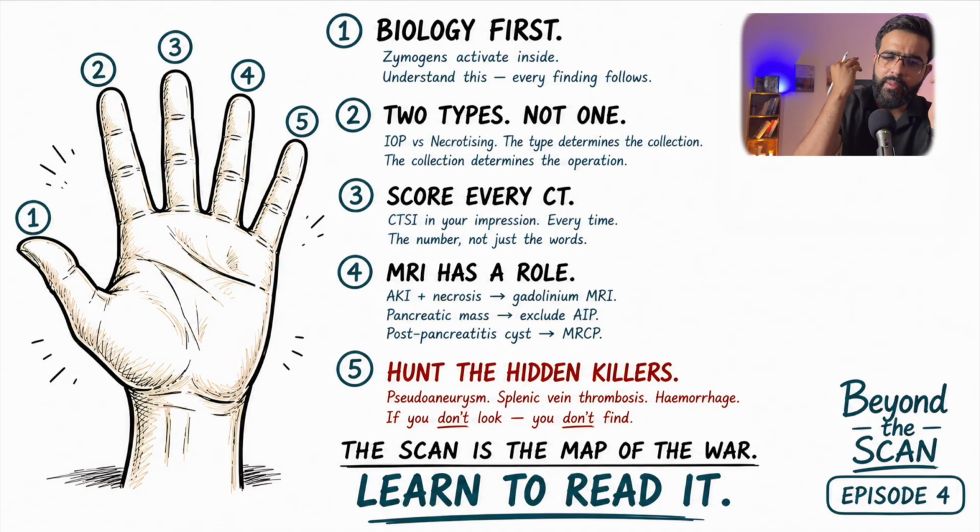Number 3, score every pancreatitis CT with CTSI, not Balthazar grade alone. The full index, necrosis percentage plus the grade. State it in your impression. The surgeon reads your report and needs to know the number, not just the words.